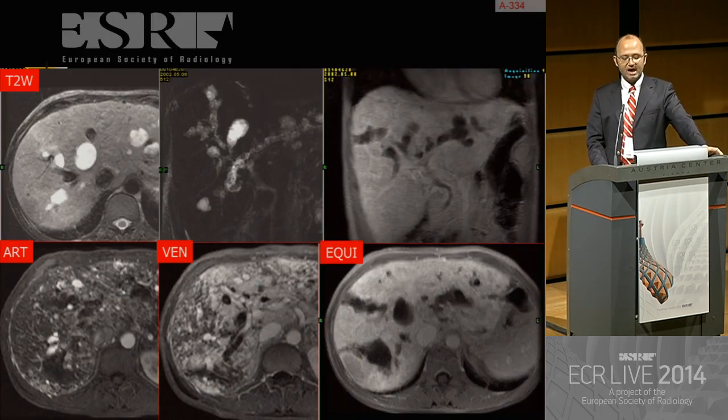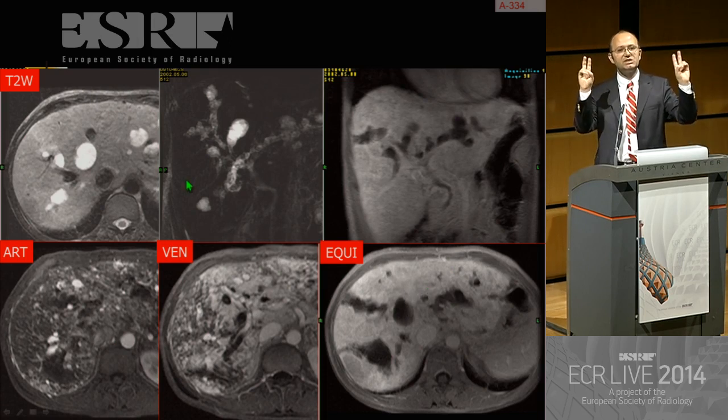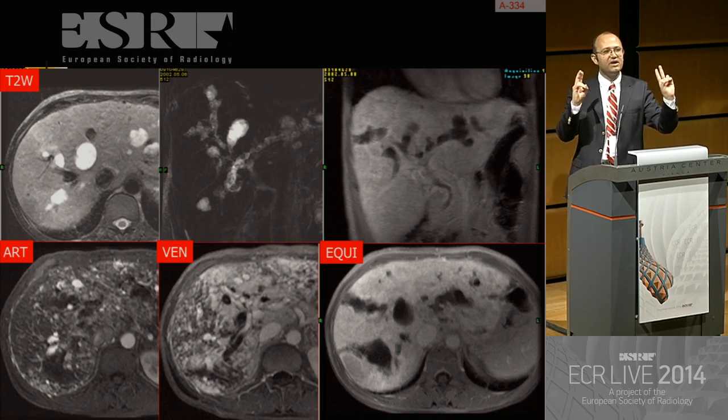Okay, this is a very interesting patient. Does anyone have a diagnosis in this patient? Because this is another typical finding. If you know it, you can diagnose. If you look at the lower phase images, you see the hypervascularity kind of blending with the normal liver, and this is like Caroli-like appearance. So if you have these two findings together, this is very typical.